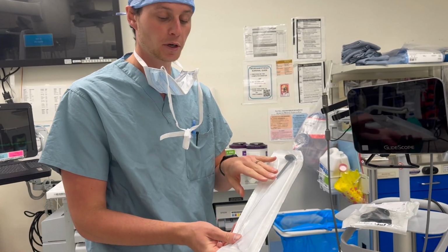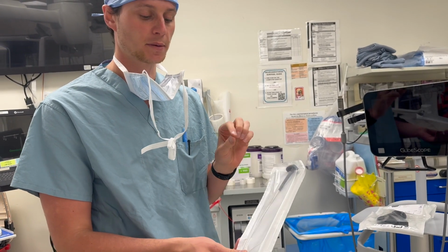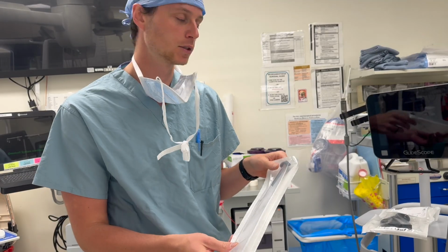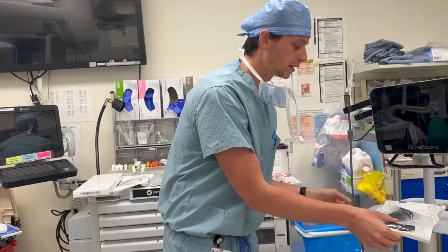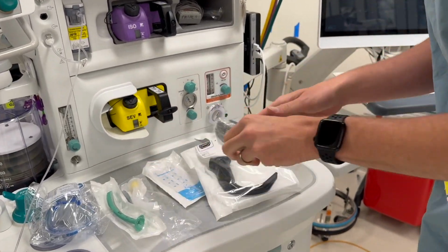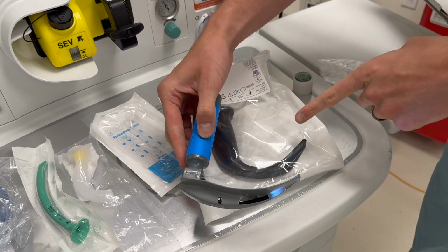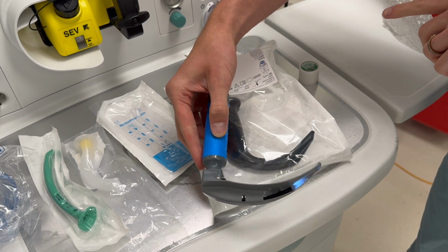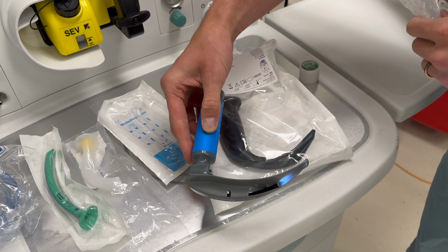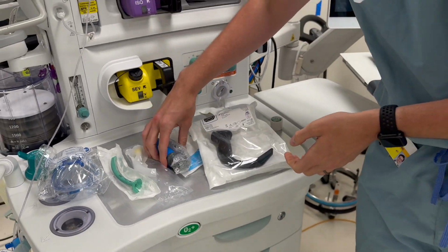Important to note, when you are using these stylets, please use lubricant when you're putting it in the ET tube, otherwise it can be very difficult to remove it from the ET tube. Just to show a little difference between our two blades here, if we compare the angulation of our GlideScope blade to the angulation of our Mac blade, we can see that the GlideScope blade has a more sharp or more acute angle. This can help with some more anterior airways or some of our more difficult airways.